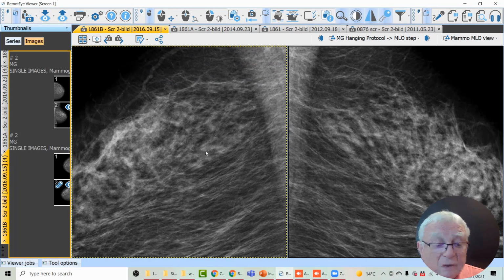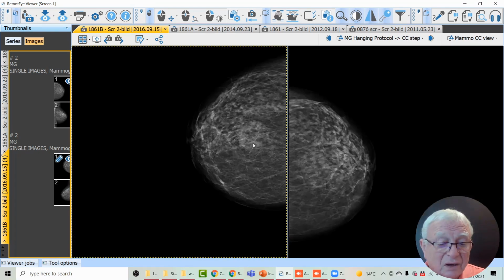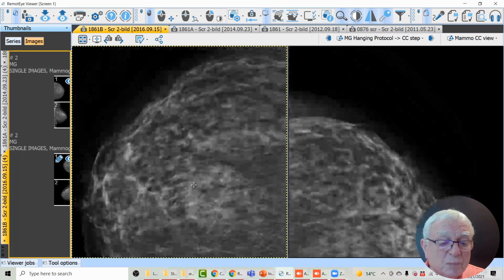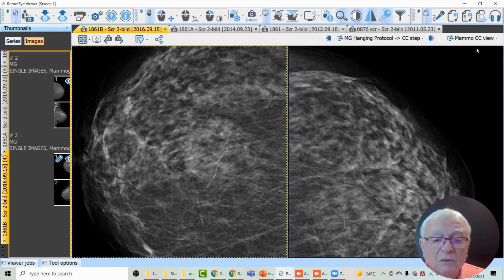And then here is another important thing. Say, is this a circular lesion? No. Is this a stellate lesion? Are you kidding? No. So what's your problem? I have no problem. Thank you very much. Welcome back to next screening.